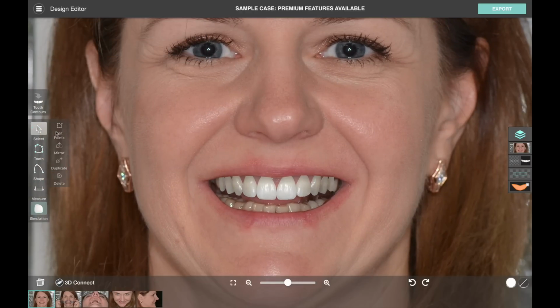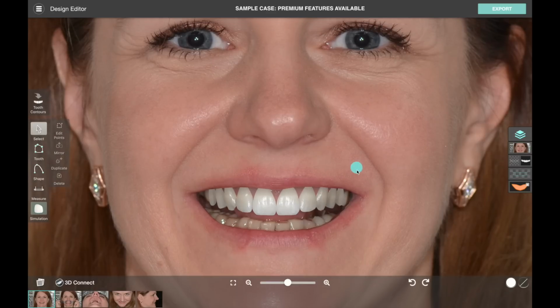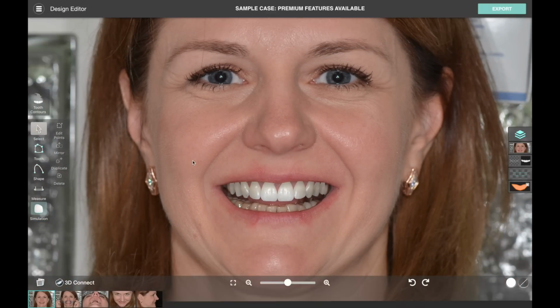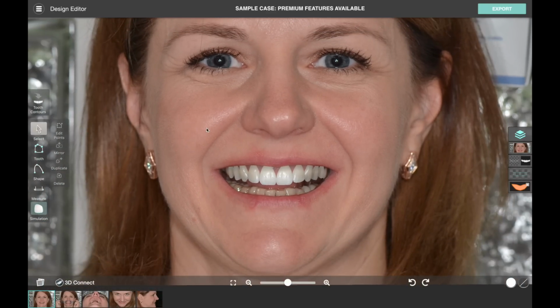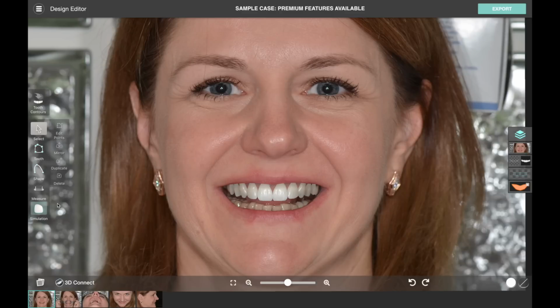Now, if you want to see what's actually going on with the smudges, you can select the select tool, and we can grab the teeth that we've created here and just temporarily move them up out of the way, and you'll see what the smudge tool actually did. So it pushed the pixels around, but because our simulation teeth are on top of that, all that mess is basically hidden under our simulation teeth, and that's how we reduce the length. So it's a very simple trick, but it helps you to kind of keep the focus on the new forms of the teeth without having the patient's existing dentition in the way.